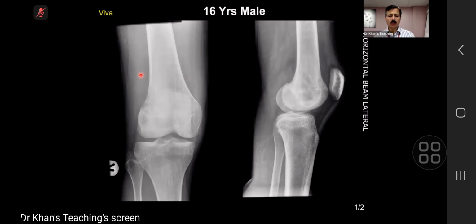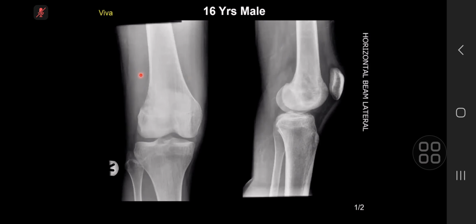Out of Ewing's and osteo. You remember the diagram, my favorite diagram? Yeah, so that's more osteosarcoma. Osteosarcoma. If you look carefully, this is a beautiful case, because these kinds of cases are shown in the exam where the findings are subtle. Look at these trabeculae and you can understand that there is a bit of destruction.